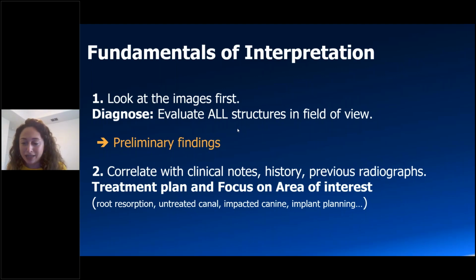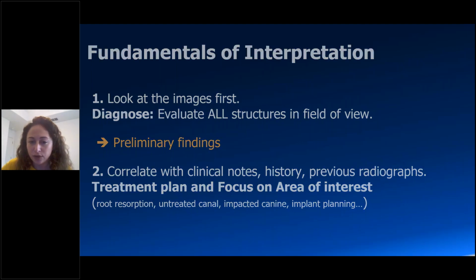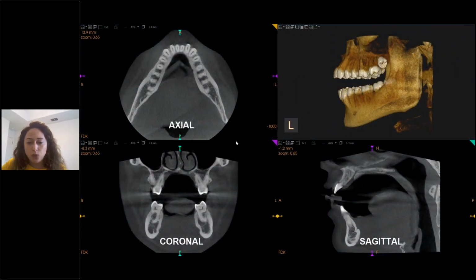What else is there in this scan? So constantly talk to yourself and ask, is there something else on any other teeth, the sinuses, in the bone? So ask yourself questions that would probe you to investigate further. And we're doing this on this view.